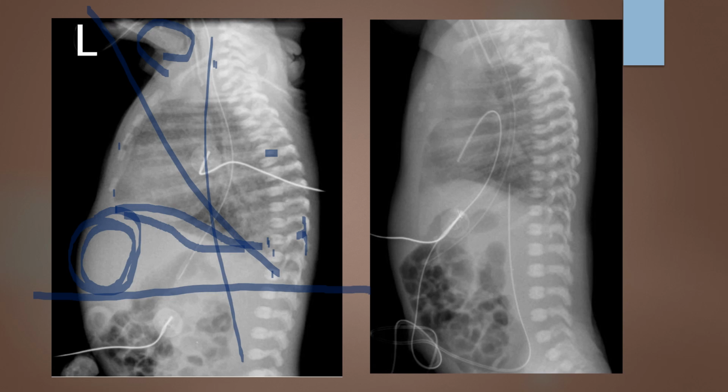Otherwise, the positioning of the exam looks pretty good. Just make sure that you're going to collimate better next time. With that, I'm going to leave you to evaluate the second one by yourself.